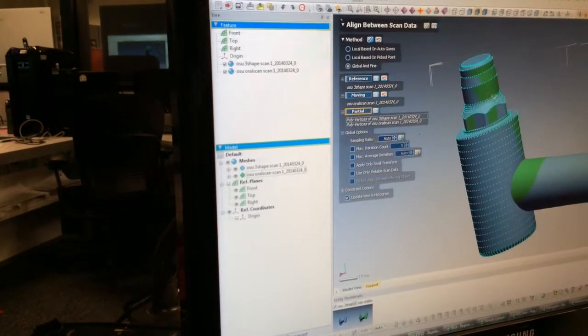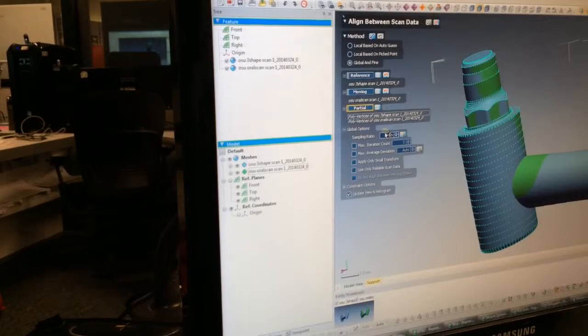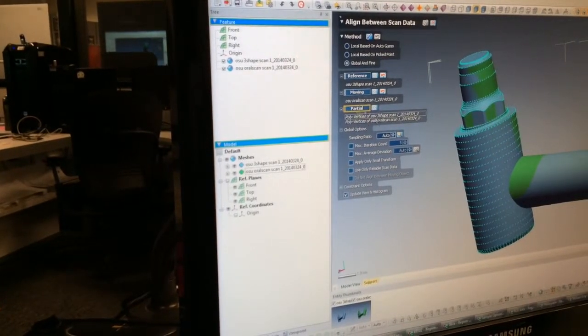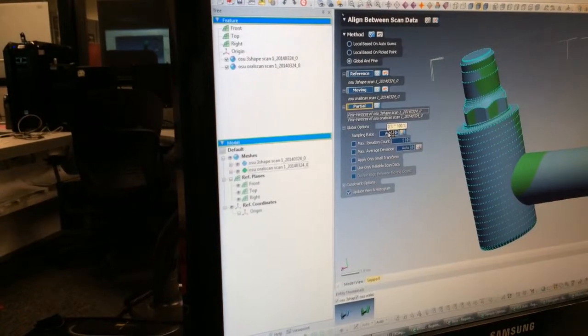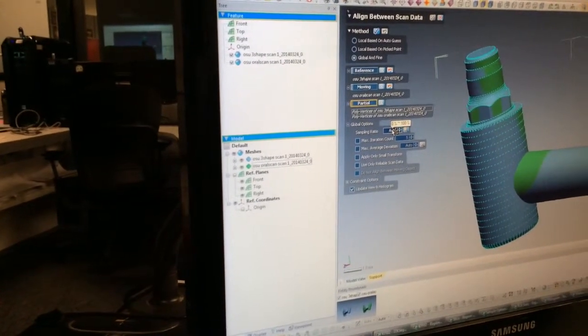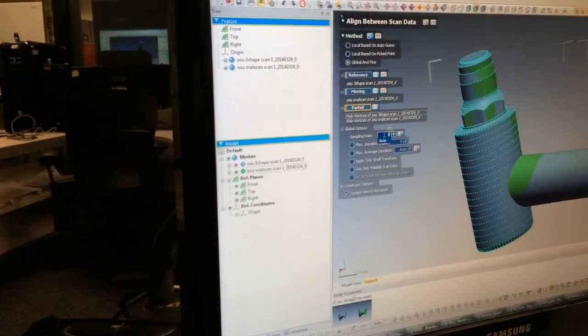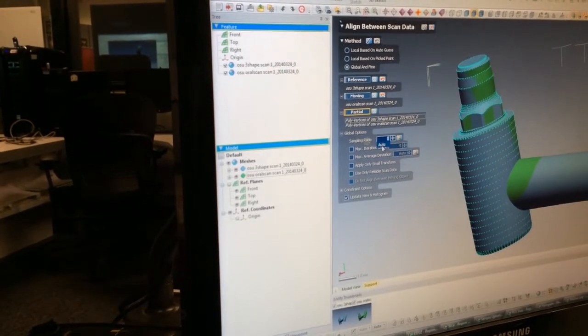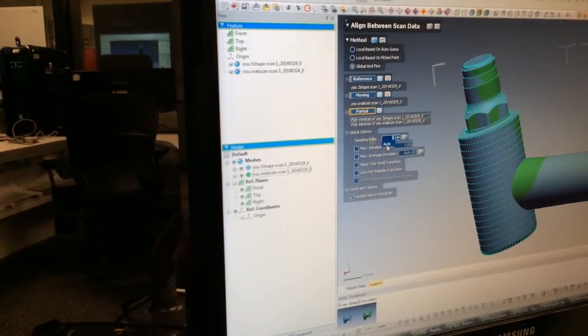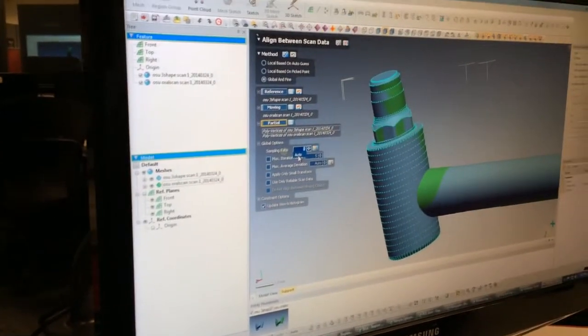The sampling ratio is how much data it's using. I don't normally do partial, so I'm not positive. Normally I set this to 100 because I want it to sample all the data. I'm assuming this means 100% of the things you've selected. Sure, that would make the most sense to me. You may want to try it with and without and see if you notice a difference.